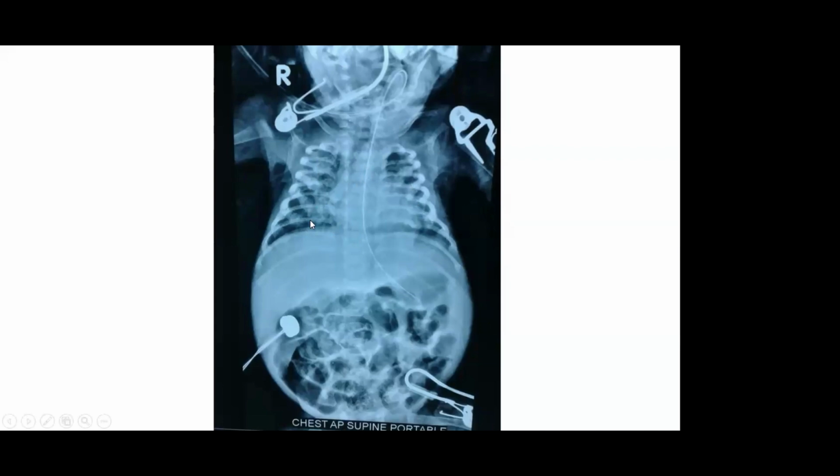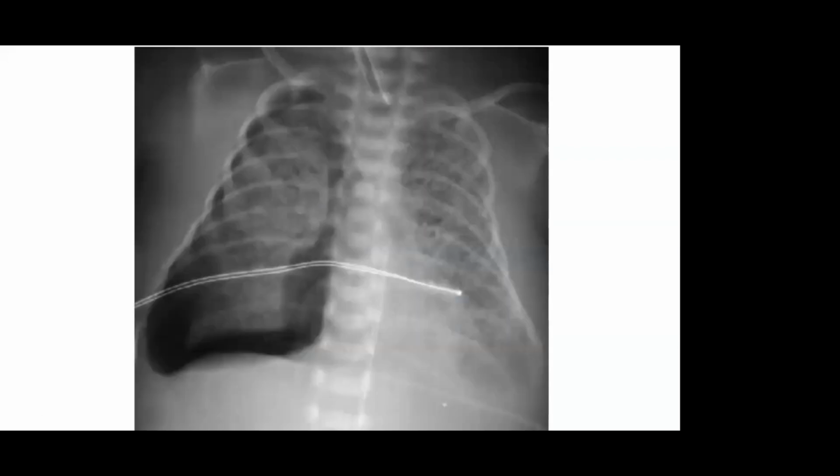So when babies who are a little older, especially premature babies, are being ventilated or developing BPD, see to it that you look at their bones also simultaneously. This will take you by surprise. No marks for guessing this. As I was telling you, if you see a basal area which is radiolucent and you suspect a pneumothorax there, you'll always see an air tracking above. So you'll never see a completely nice lung field here and a radiolucent base. That kind of pneumothorax will never happen.